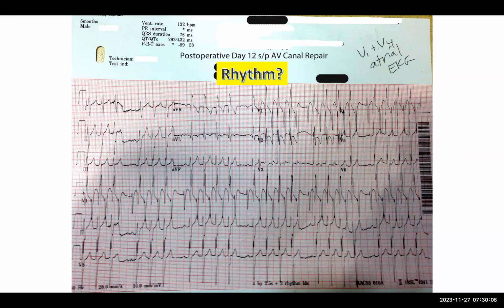I would watch them carefully, and I'd want to see on telemetry what happens at slightly slower sinus rates. For example, what's the heart rate when the patient is sleeping? Also importantly, are there times of higher grade block? We're seeing here what we think is Mobitz 1. It could be Mobitz 2. Are there periods where it appears as if there's no conduction at all? That can be the case. You can have intermittent changes in the conduction.